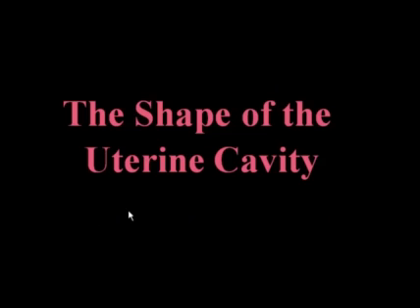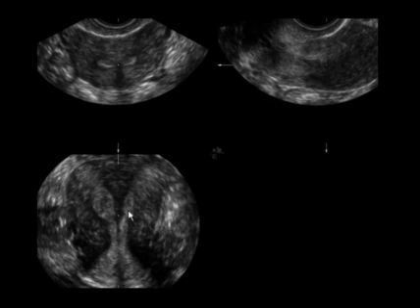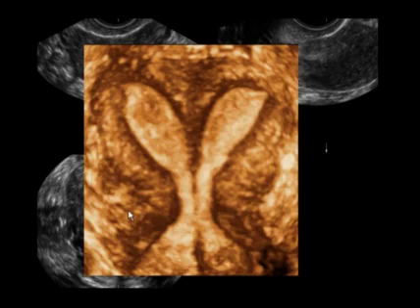Now let's look at the shape of the uterine cavity. The prevalence of Mullerian duct abnormalities is really quite elevated in those who have infertility, between 3 and 10% in patients who have infertility and recurrent pregnancy loss. So let's look at an example here. Here is a patient who has a septate uterus all the way down into the cervix.